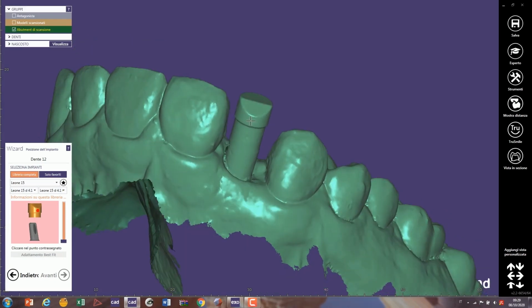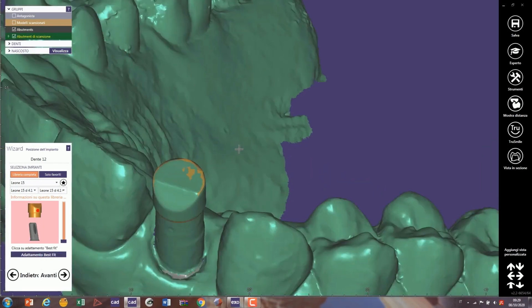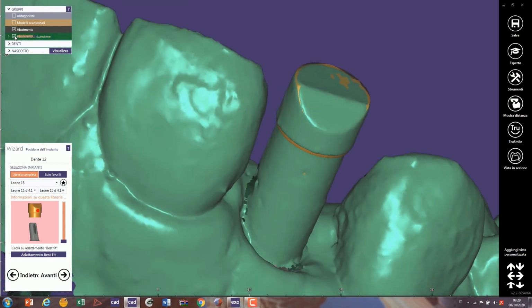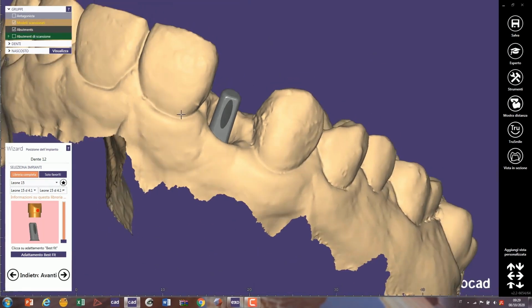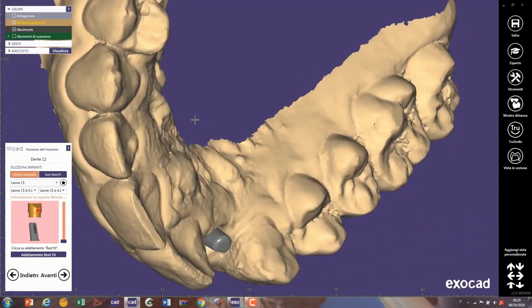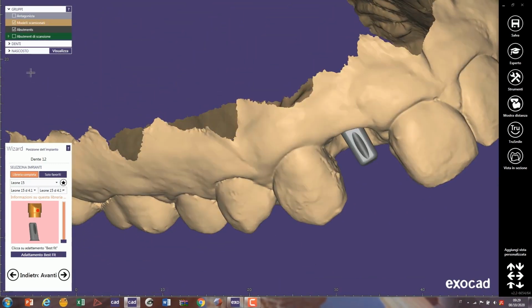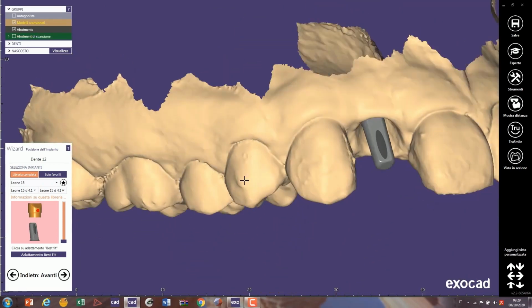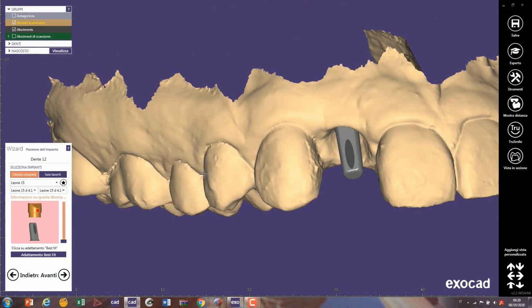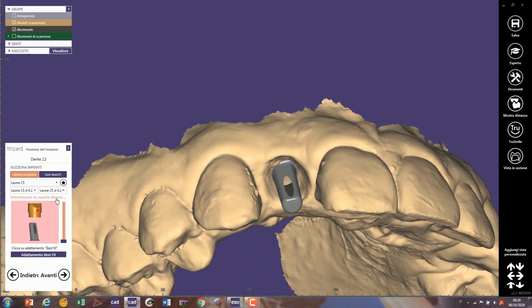Then the dental technician receives this scan inside a computer-assisted design software, in this case exocad, and needs to replace the mesh of the scan body with the library files that are all coupled inside the library in the perfect position. And this transfer or disposition of the implants is made through this device, the scan body. So it's very important to have a perfect alignment of the scan body mesh with the scan body library file, because all the other components in the library, like the different T-bases with different angulation and features, are all linked in the correct position through this scan body that is available in the library. So it's very important to perform this superimposition at best.